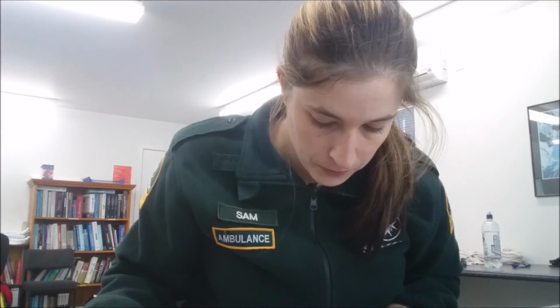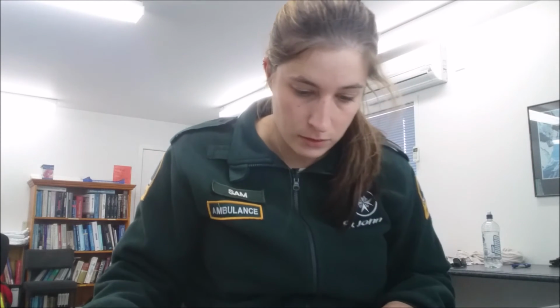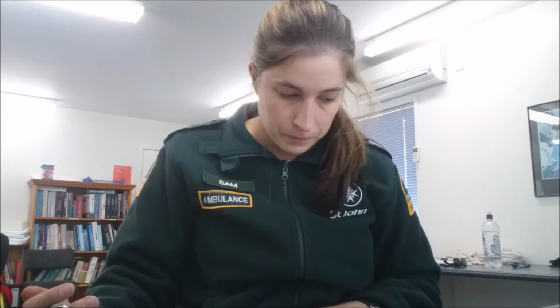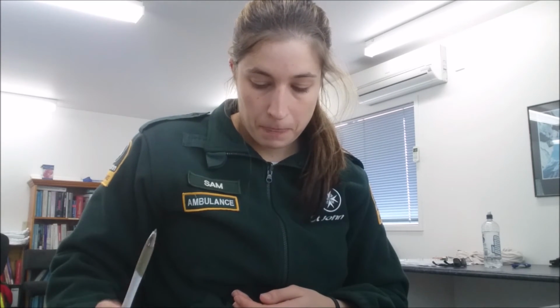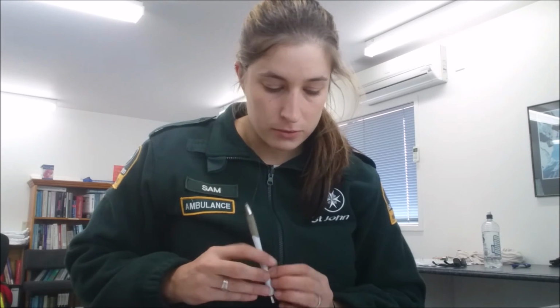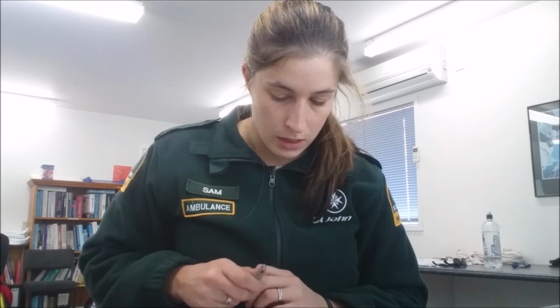And so the interpretation: I've got a septal anterior STEMI with some lateral involvement as well.